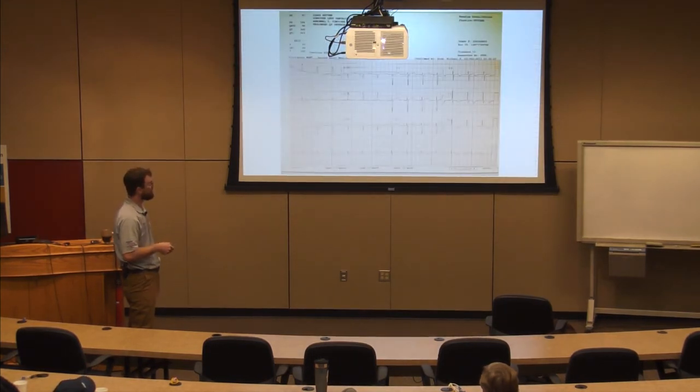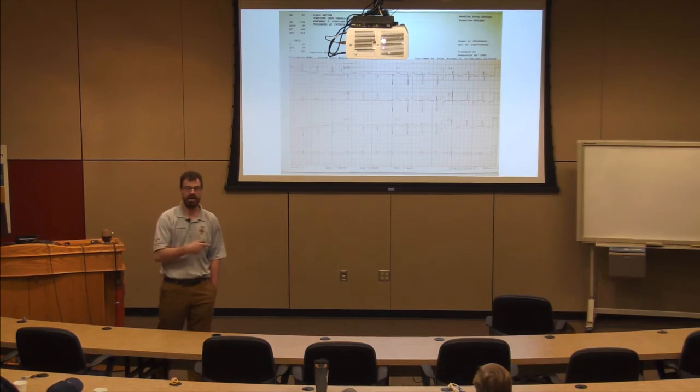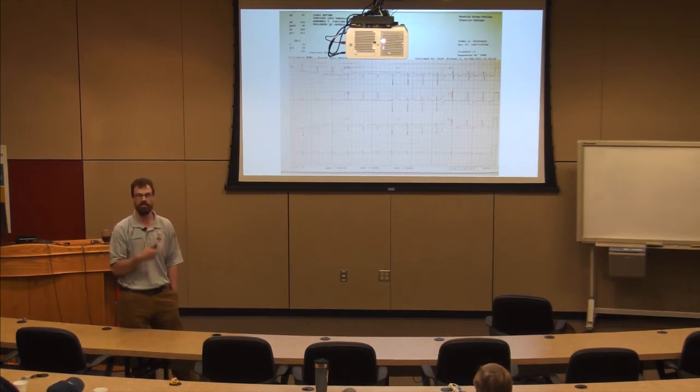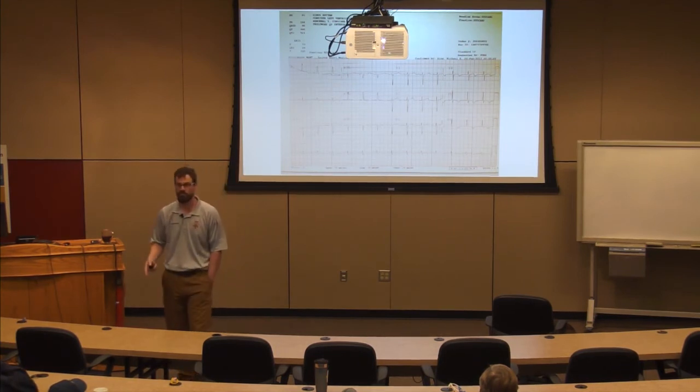And if you look at her baseline EKG, I have a QT interval here to here, which you could argue is more than half of the RR interval, particularly when you look at it out here. But when I see my QT corrected, it's 511. So, I'm not saying that you have to diagnose the torsades before it happens on the little old lady with cold and flu symptoms who's on azithromycin. That's not my point. But here's an example of somebody who just took a bunch of something.